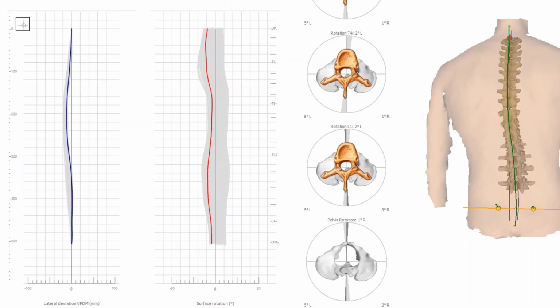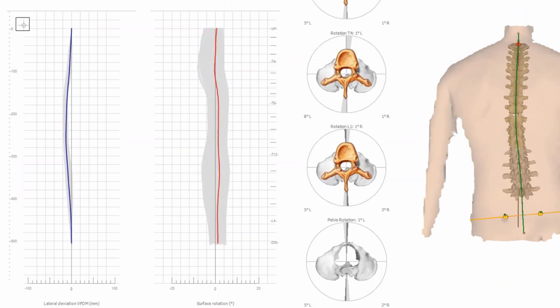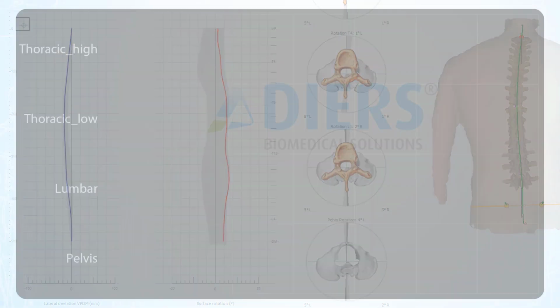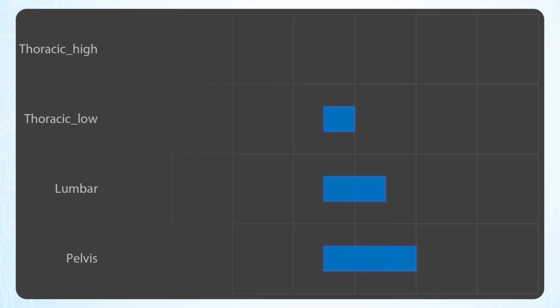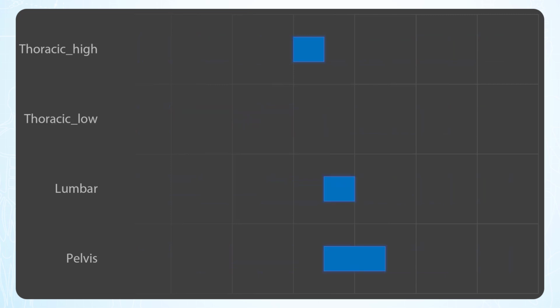An important finding that has been taken up in the recent past in the context of scientific considerations is the model of impulse transfer. According to this, the rotational impulse is carried out in an ascending direction from the pelvis to the shoulder girdle. A fine intersegmental spiral can thus usually be observed well. However, since adjacent segments rarely show great differences in their rotational behavior, it is advisable, for the sake of simplicity, to initially think in terms of fixed segment blocks that rotate in the same direction, one after the other in ascending order.